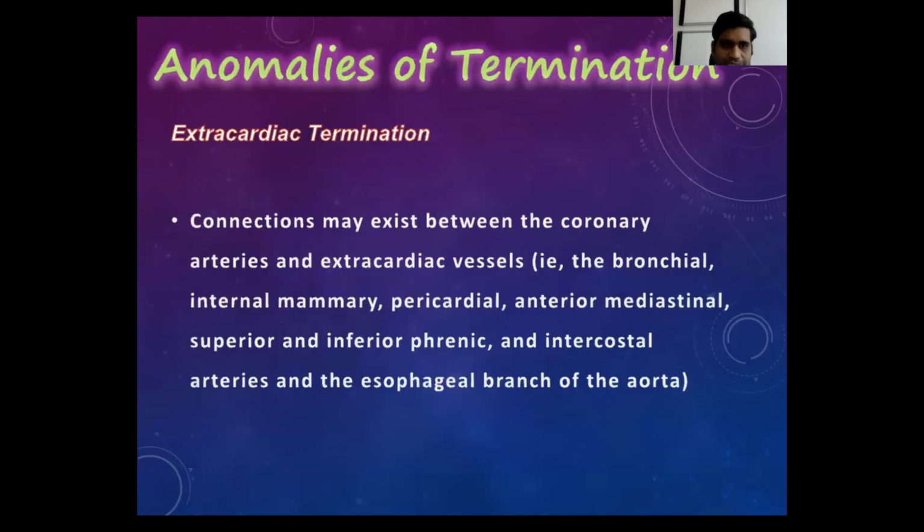One more thing is called extracardiac termination. Here the coronary artery will open into extracardiac vessels like bronchial arteries and internal mammary arteries. So in this condition, we have to see the pressure gradient between the two systems.